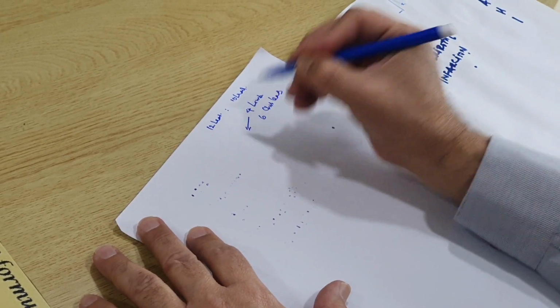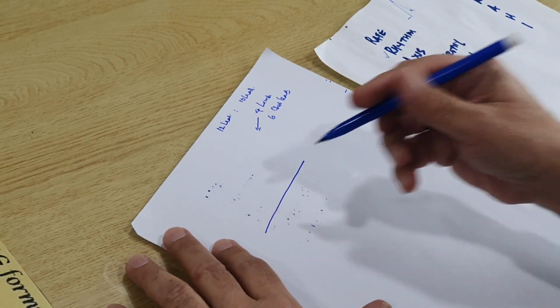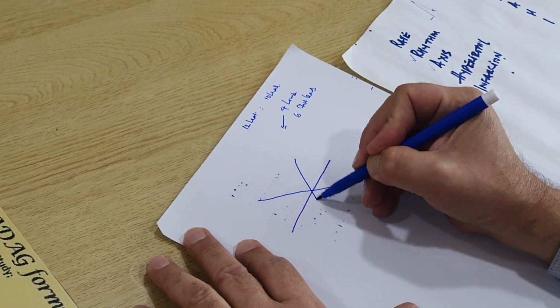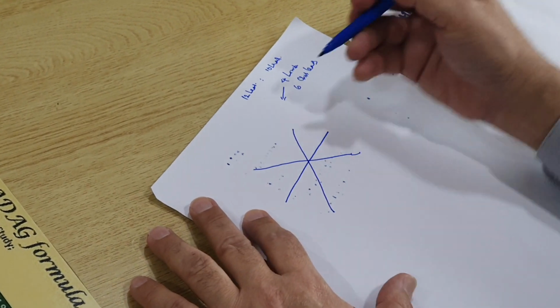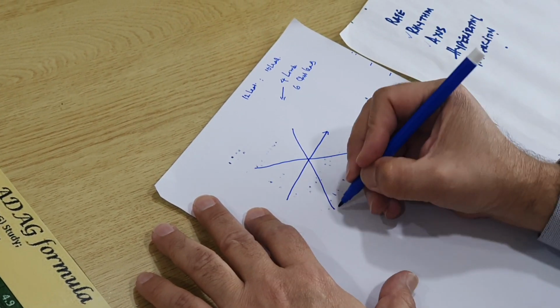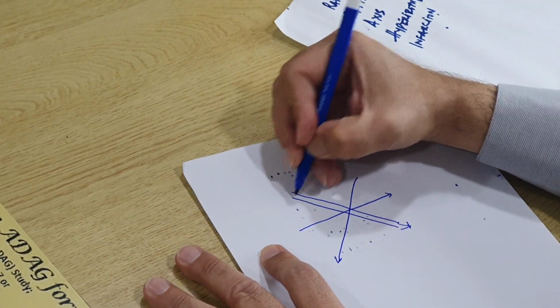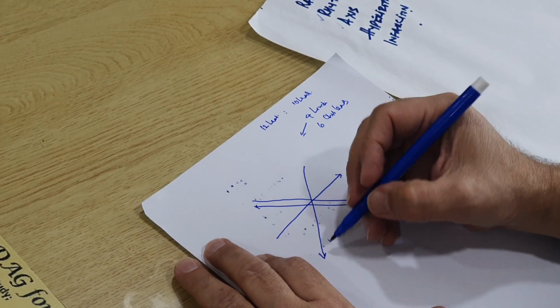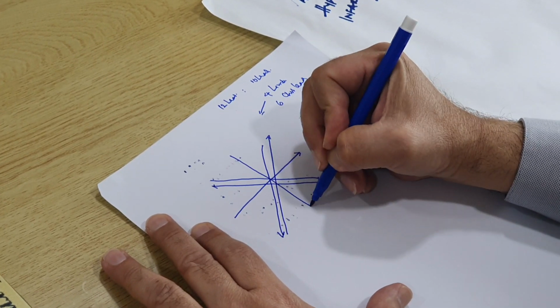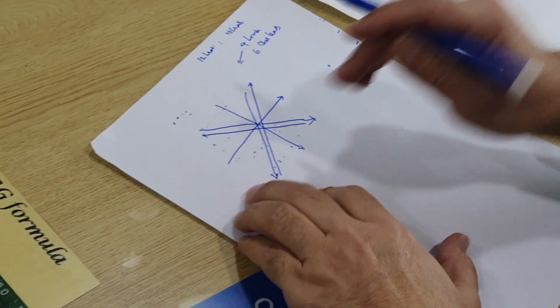These 4 limb leads are like this. So draw a line like this, and then another one like this, and the third one comes like that, and draw an arrow here, draw an arrow here, and another one here. But then parallel to these lines, draw some other lines. One line is here, the other line is here, and there is one line in the middle, which is like this. So these are your limb leads.